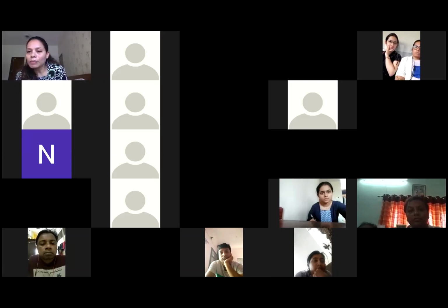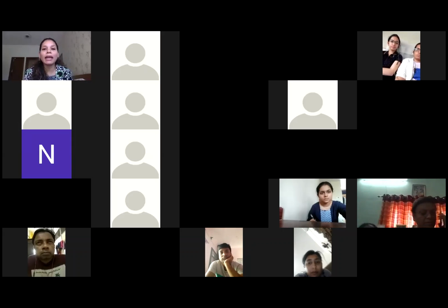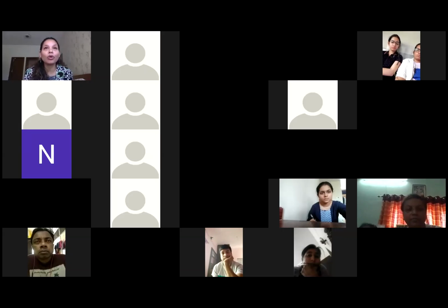For toxic optic neuropathy, 24-2 followed by 10-2 if a small suspicion. So Dr. Revati is asking for toxic optic neuropathies, a 24-2 followed by 10-2 if a small suspicion lesion is seen. Yes, definitely. Suppose if I would have done a 30-2 in a patient like this and realized that no, I'm not actually able to see any defect, then I will go back to a 10-2. Many a time there are situations where the patient is saying that he cannot see and you may not pick it up on a 30-2. So in those cases you have to go in for a 10-2.